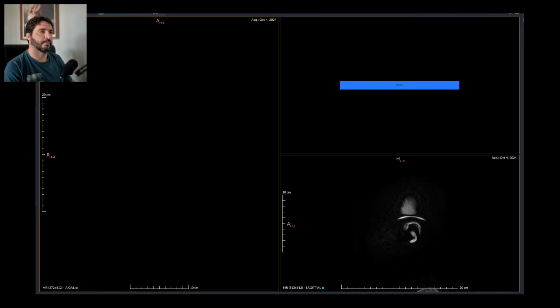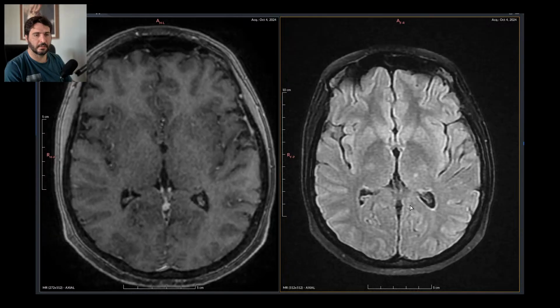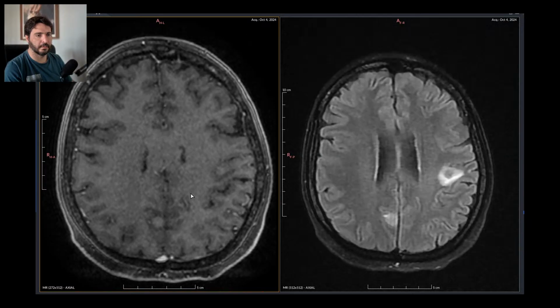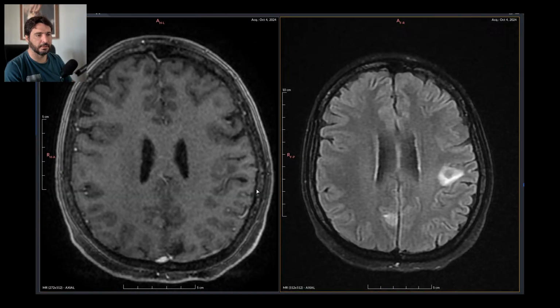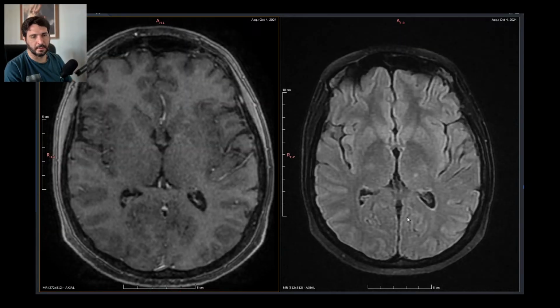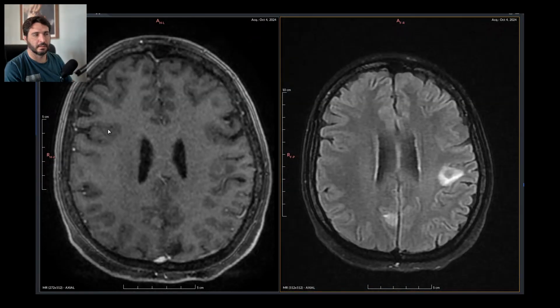I'm going to do an MPR of the post-contrast volumetric T1 with contrast enhancement right there, so I can localize the lesion on this very thick FLAIR and see it enhance right there. So this is an enhancing lesion, and right there yet another enhancing lesion, intra-axial enhancing lesion right there, and there is marginal edema. So heterogeneous, it's bright on T2 and FLAIR, hypointense in T1, it enhances, and it has signs of restricted diffusion.